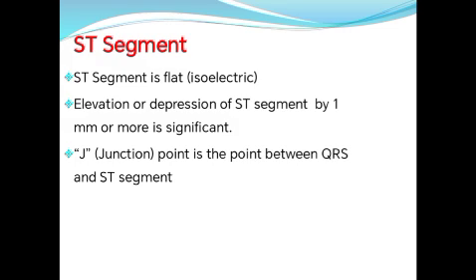Any elevation or depression of the ST segment by 1 millimeter or more is significant. We can determine the ST segment change, elevation or depression, from the J point or junction. The J point or junction is the point between the QRS and the ST segment.